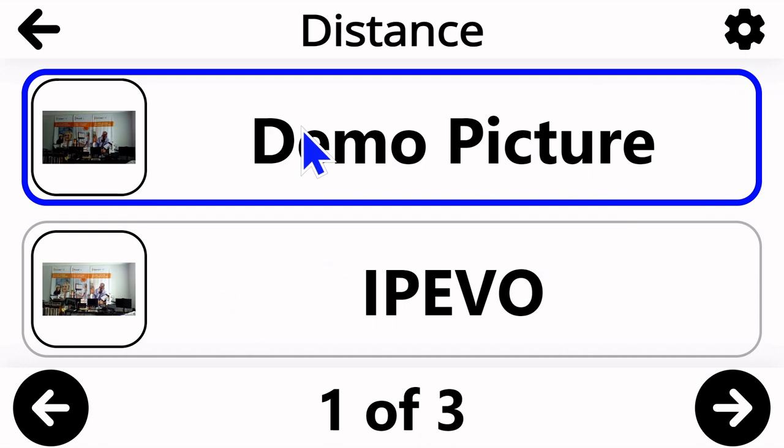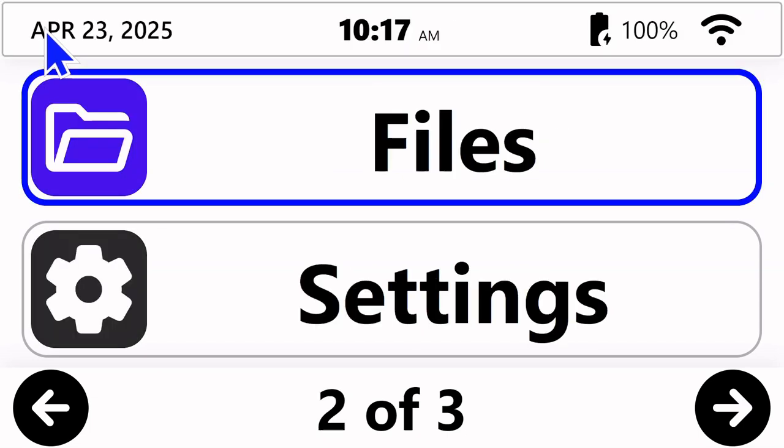I do hope that you found this video to be helpful in understanding how to use the distance application and some of the new features that we've implemented with version 1.3 of Prodigy for Windows.